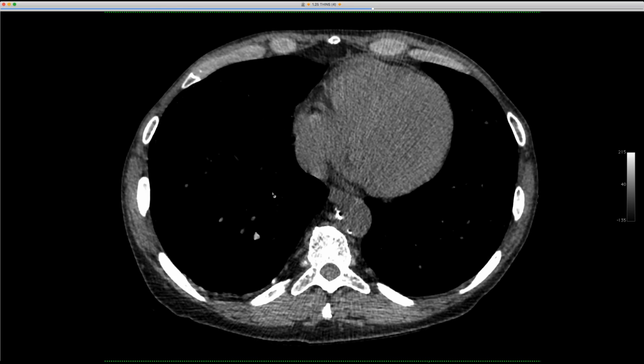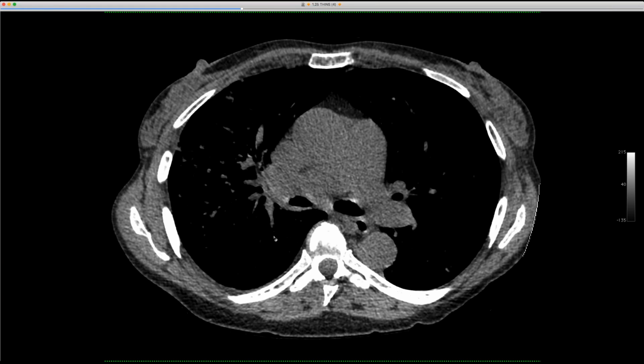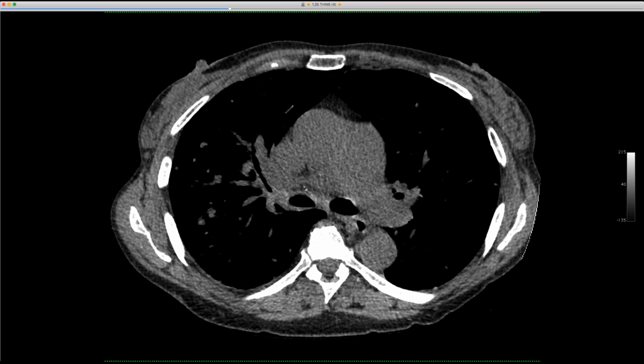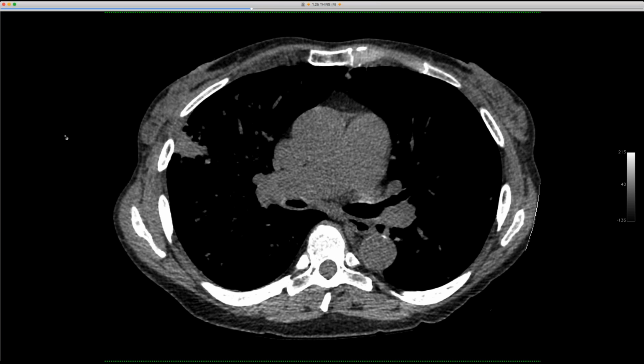And then the important findings for us that we have seen over the years is absent pleural effusion, and really the lymphadenopathy in this case is pretty modest. It's very minimal enlargement, something you never see on a radiograph. There's some thickening around the bronchus intermedius, makes you wonder if there's airway involvement as well.